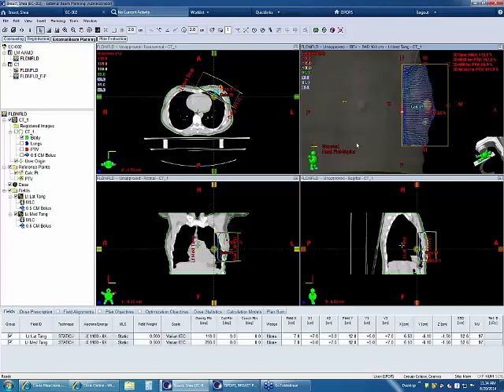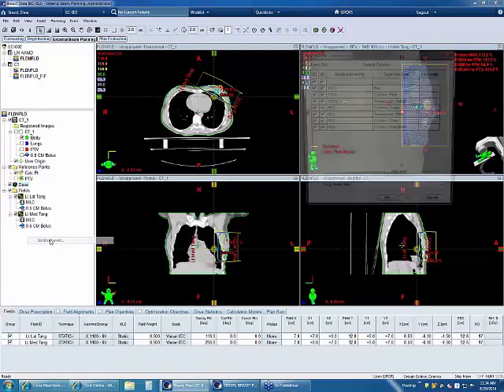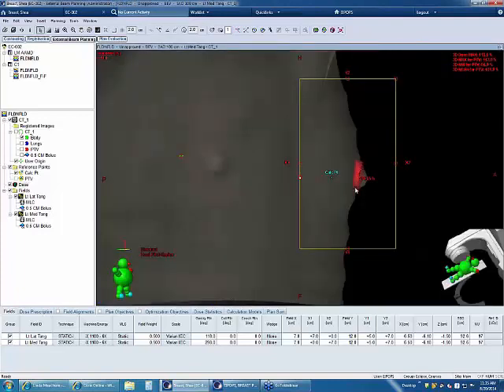So now I have 113.5% hot. And what I'm going to do over here with my isodose lines is right-click and go to isodose levels. And I'm going to bring this down. I'm going to turn everything off in 3D except for the 110, but I will actually make that one 111 and say OK. This will be the first, and of course it's right over that sensitive medial spot, mid-plane spot. This will be the first line that I put a field in field on.